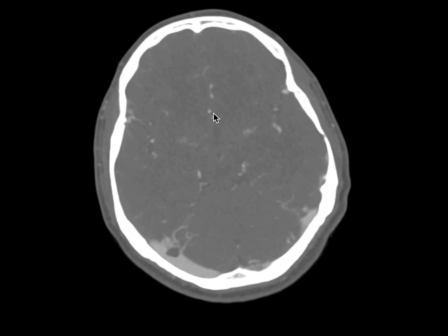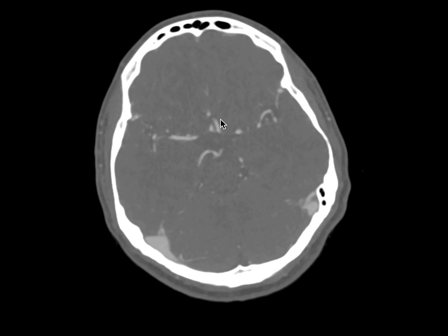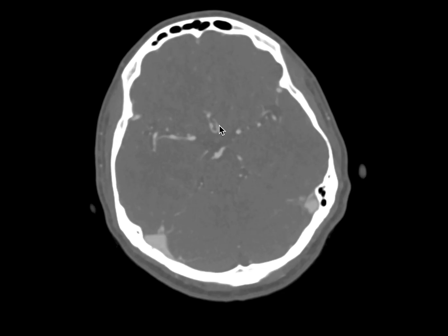The additional central artery seen in such cases is thought to relate to persistence of the embryonic median artery. If alternatively only one central artery is seen, likely representing the embryonic median artery, and these A2 segments on either side are not developing, you have what's called an azygos anterior cerebral artery. One other variant I'll talk about will be the bihemispheric anterior cerebral artery. Here you'll have one of these A2 segments hypoplastic.